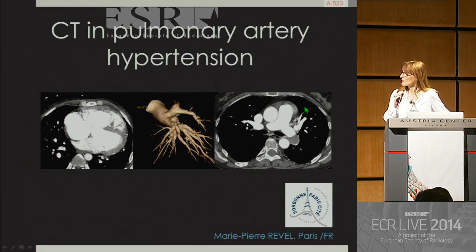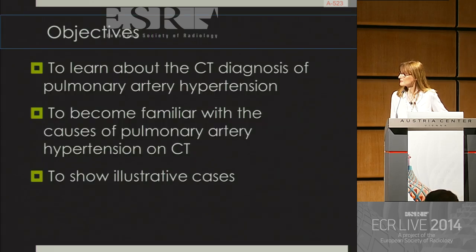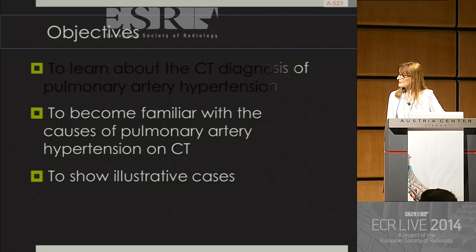So my topic is CT in pulmonary artery hypertension. Briefly, the learning objectives: to learn about the CT diagnosis of pulmonary artery hypertension, to become familiar with the causes of pulmonary artery hypertension on CT, and I will show you some illustrative cases.